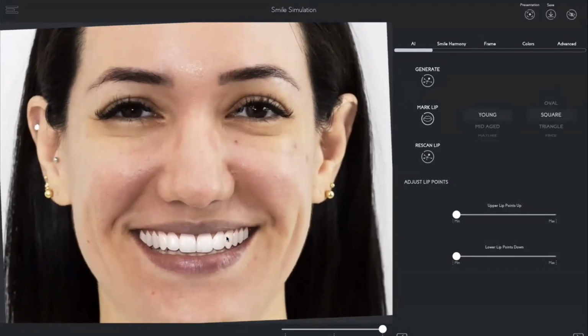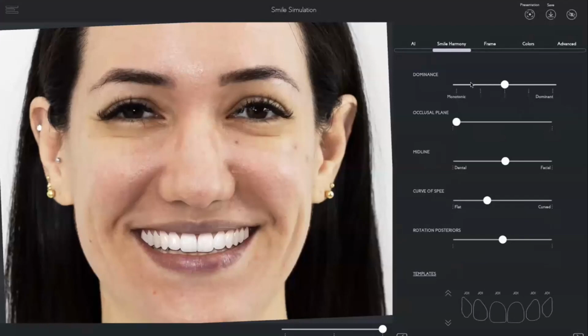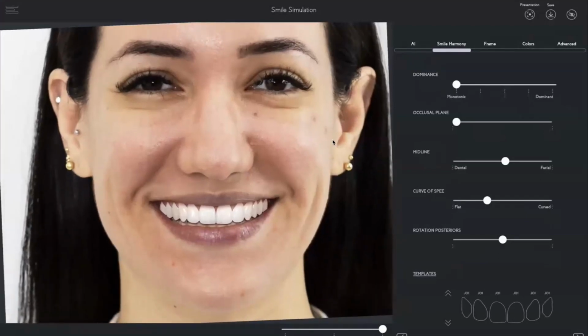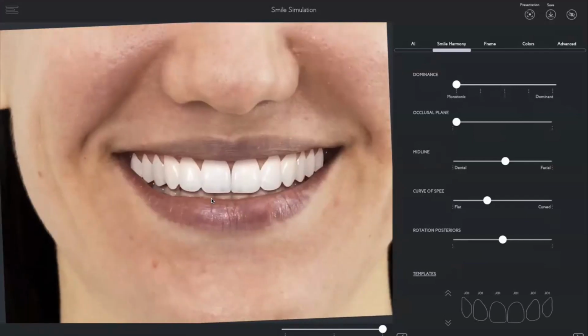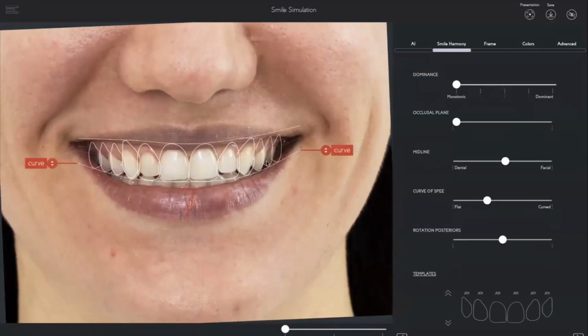One of the most important and very powerful features in the smile harmony is called smile dominance. You can have a monotonic smile where you can see that the laterals are on the new smile curve. They lie on the new smile curve, right? We redefined with our smile frame the smile curve, following a little bit the lower lip, the roundness of the lower lip.